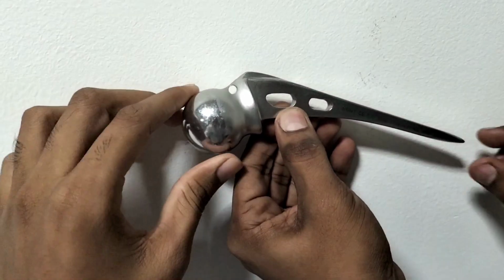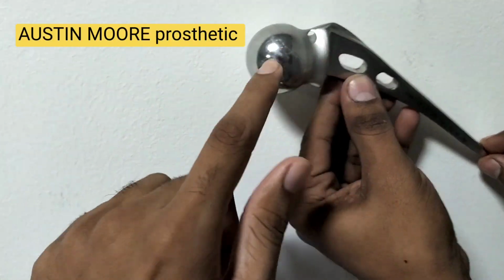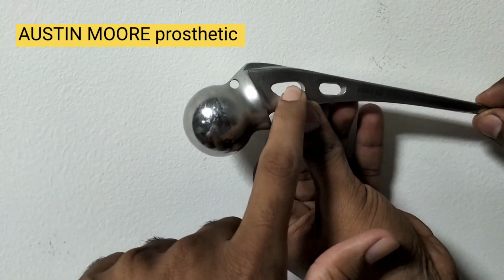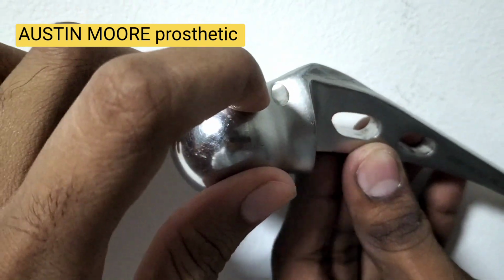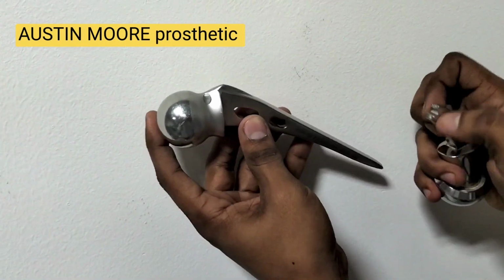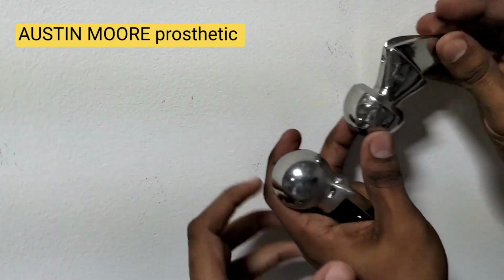Here you can see this is the most famous one. This is an Austin-Moore prosthesis. You can see there are two fenestrations, which help in bone formation, and there is one more small hole. It is used for pulling. It is used for hemiarthroplasty for fracture neck of femur. And this is Austin-Moore.